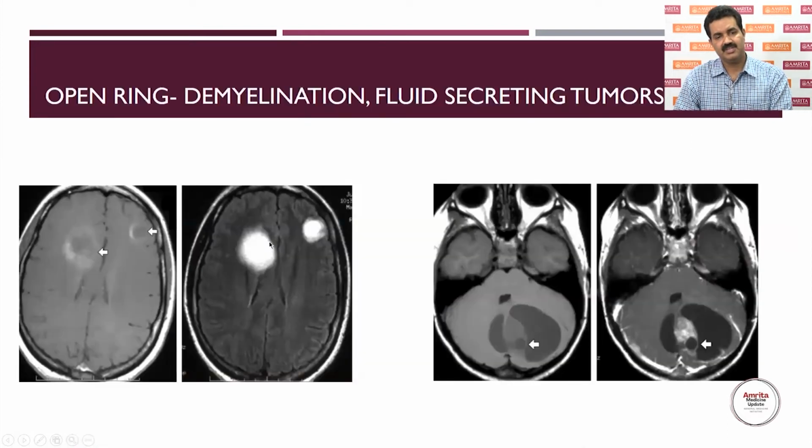So here, similarly, you can see this patient had a history of multiple sclerosis, stopped treatment, and came with a new lesion, new symptoms, and you take a T1 with GADO, you can see some enhancement, 2 rings. So these rings are open towards the cortex. This is called open ring configuration. So this type of enhancement is seen with tumefactive demyelination. You can see the restricted diffusion in this, but you can see the clearly open ring towards the cortex.